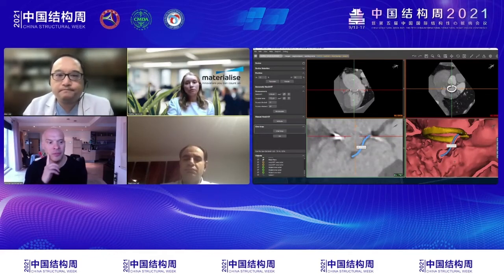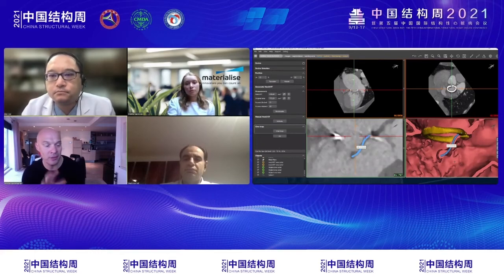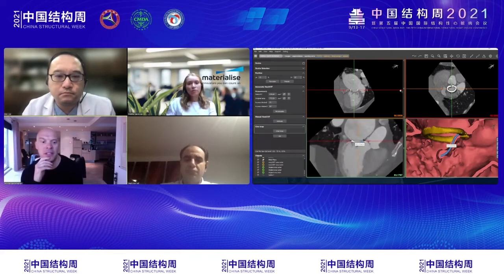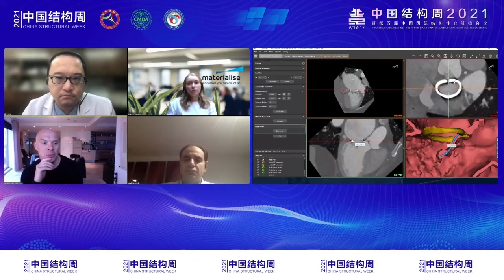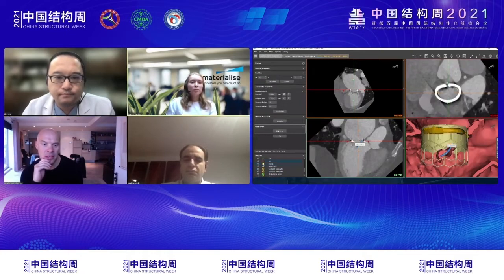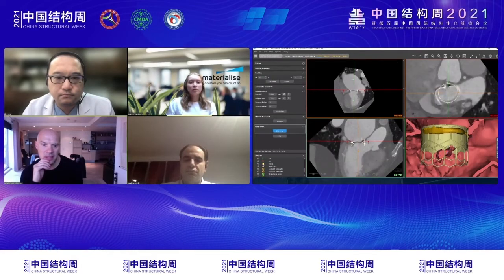But Winthe, for my understanding, I thought this Cine loop was quite impressive, that you could appreciate that movement of that anterior leaflet. Can you do the same loop with a device in situ? Yes, of course. Right now, the device is just hidden, but if I pop it up again, you can then see how that leaflet will behave.